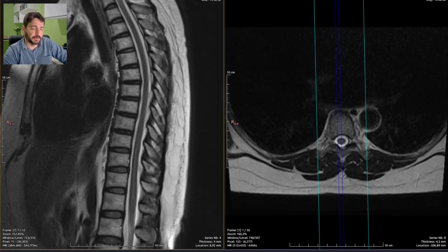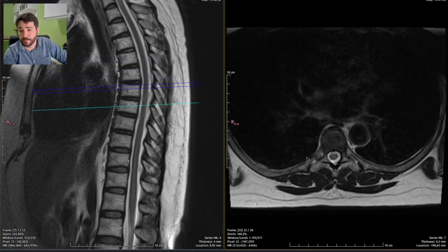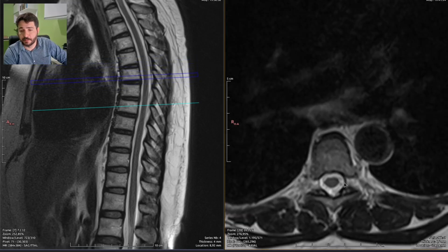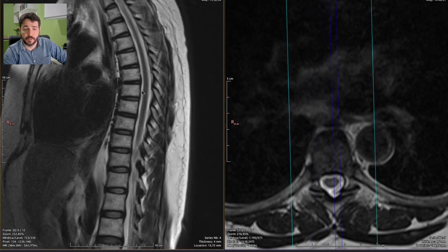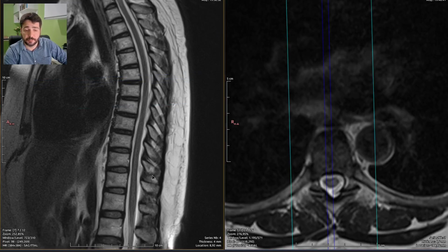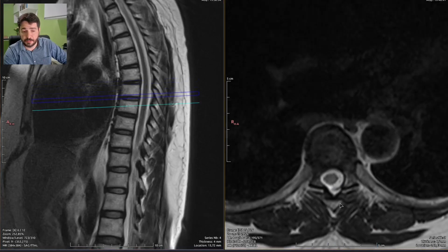Oh, excuse me. Oh, I'm sorry. Yeah, just a tiny, very small bulging protrusion right here. We're going to count that segment in a minute.